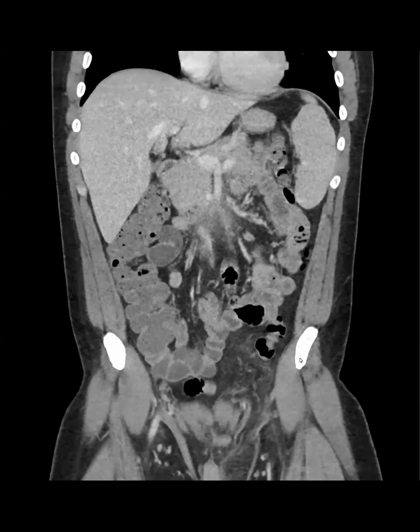My understanding was that this is not okay, because now the rectal wall is up against the prostate, and the reason they put the spaceOAR gel is to protect the rectum from the prostate so that they can radiate and reduce the risk of radiation-induced proctitis. And so now the rectal wall is up against the prostate, so that increases that risk. In fact, the risk may be increased now, right? Because the rectal wall will be within the radiation field. That was my understanding based on the discussion that I had.